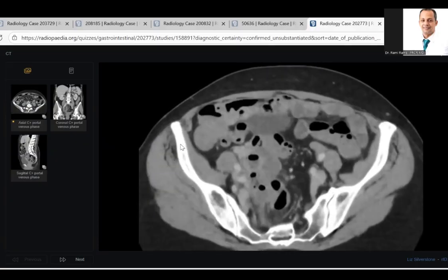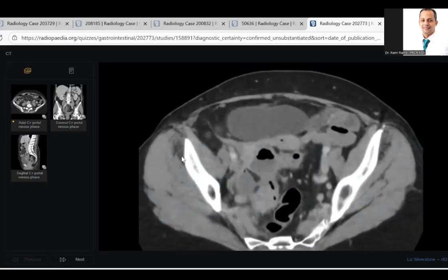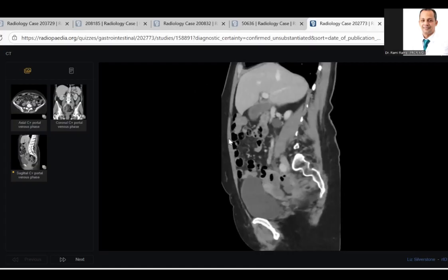In addition to that, there is some fluid-filled structure. I don't know if it's the tube or if it's something else. Can you show me this on the coronal images? It's in the right hemipelvis abutting the right adnexa. Okay.